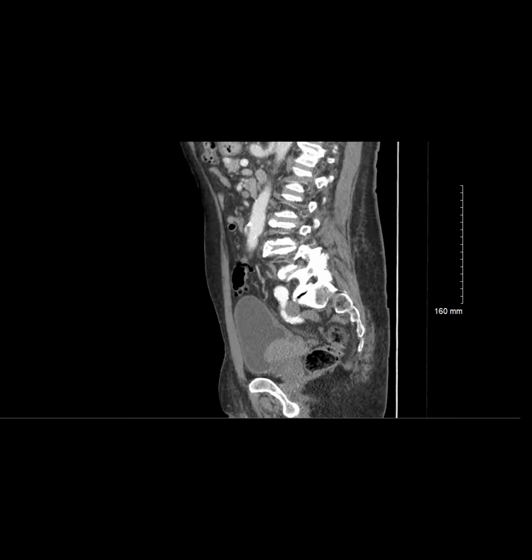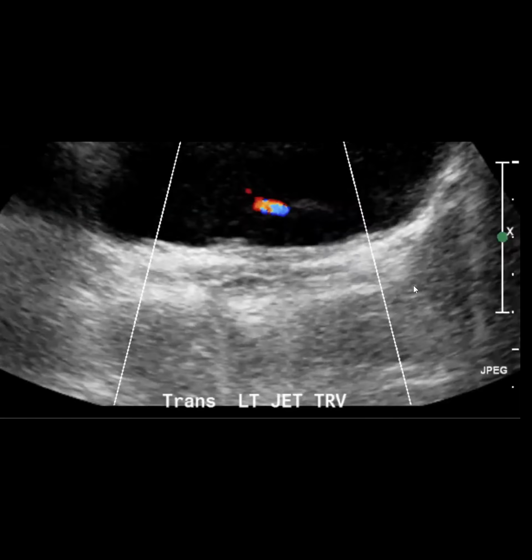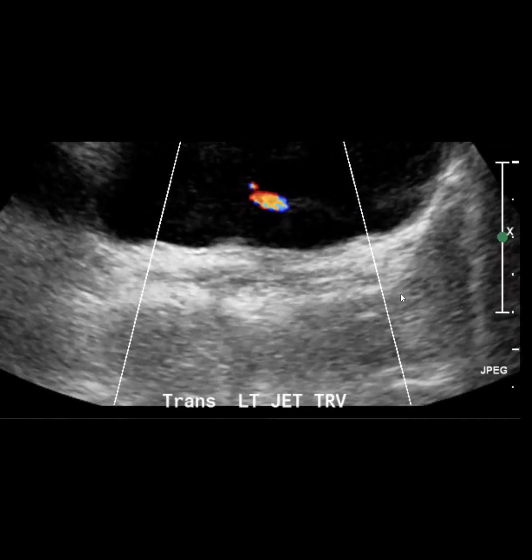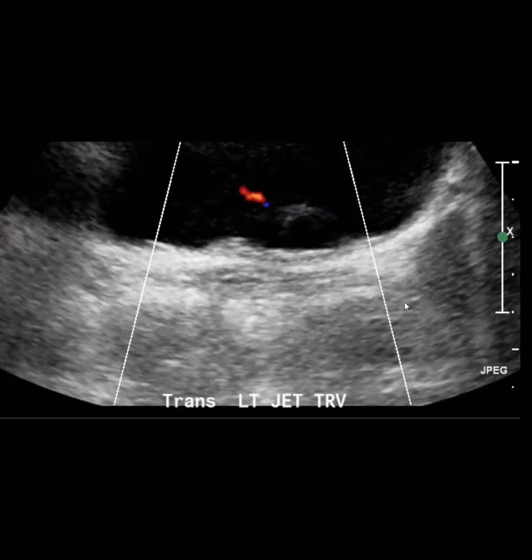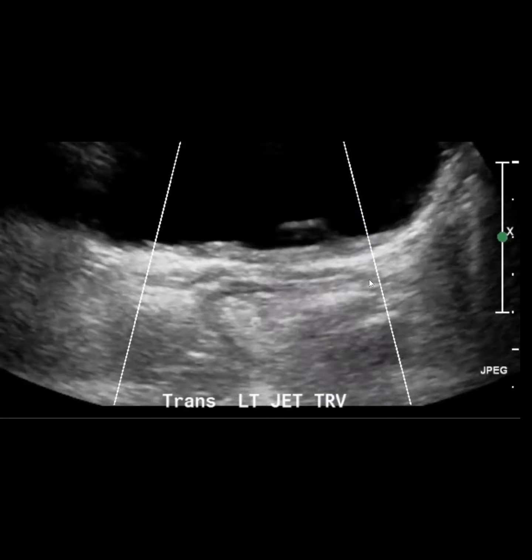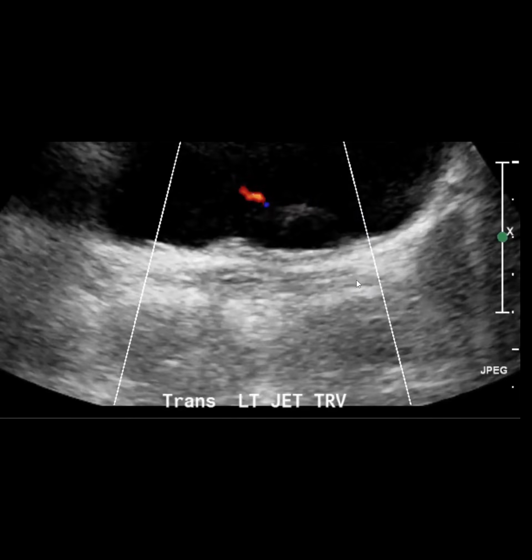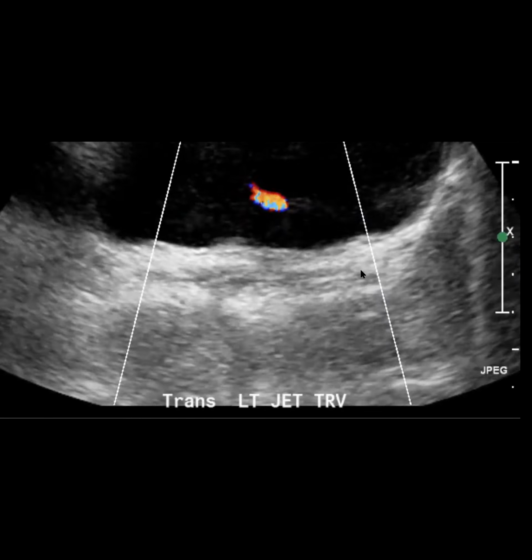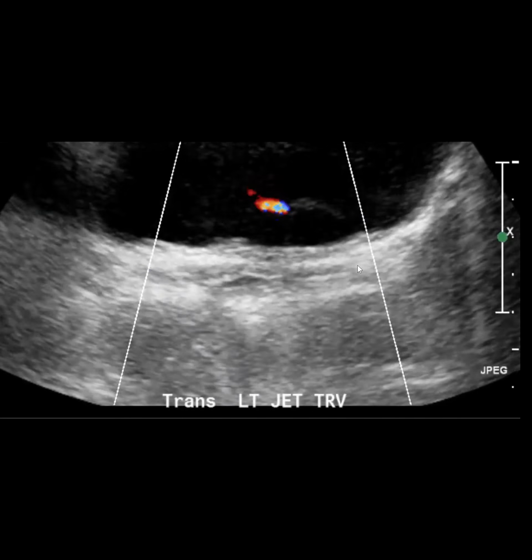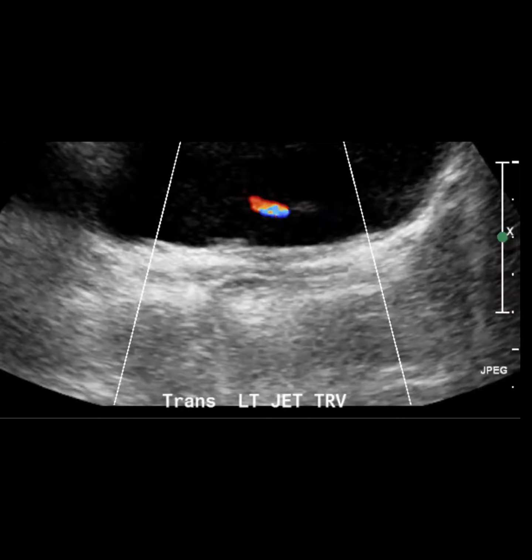Zinner syndrome. Nice. Excellent. All right, so I just wanted to run through this. This is literally a show and tell. This nice Doppler cine, I don't know if you can actually see the grayscale on this. Ureterocele? Yeah, indeed. This was a cute fire-spewing ureterocele. This was an incidental finding in an older person, nothing to do with the Weigert-Meyer and pediatric ureterocele. All right, I'm going to stop sharing. That's all I have.